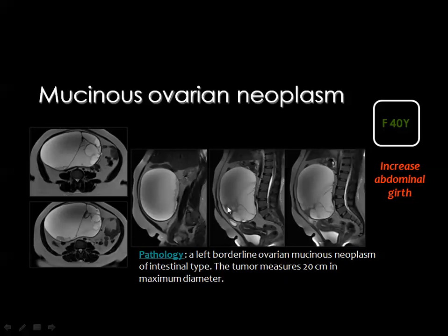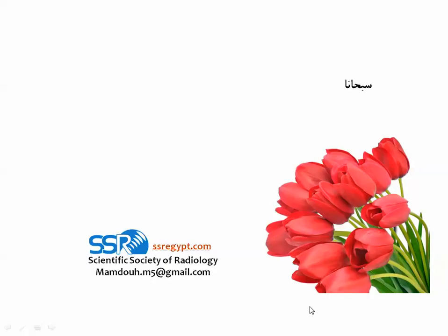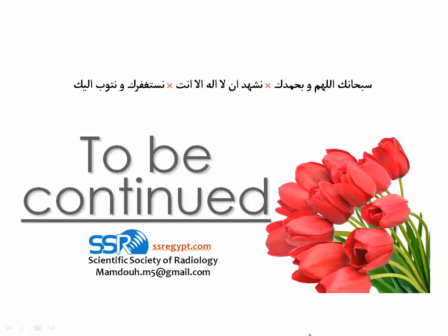The cyst is big, there are multiple internal septations, and one of the criteria of mucinous cystadenoma by MRI is that you may see some difference of signal between the cyst components of the lesion. Like this here, you see this cyst is somewhat bright compared to the adjacent one. And this is, of course, due to the difference in the contents of this very big tumor.